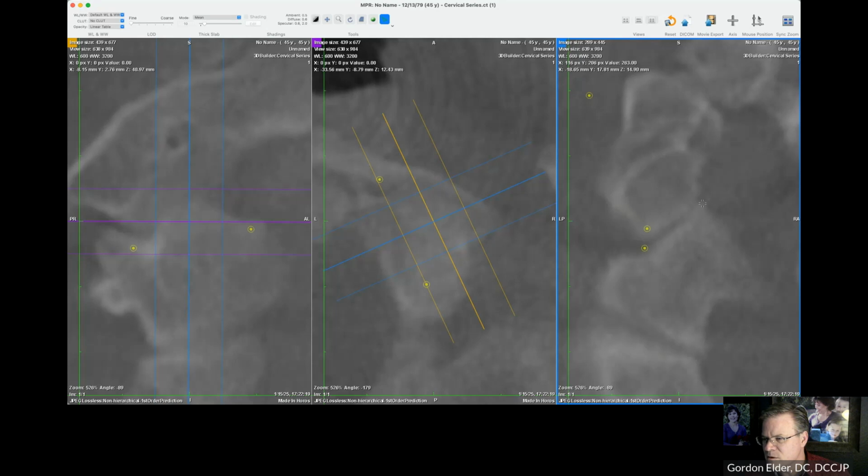Then you might look like this one is a little bit further to the right than this one if you're looking to the ground. But let's actually use, I don't typically put this in here, but let's measure 90 degrees parallel to that. It's going to be about right there.